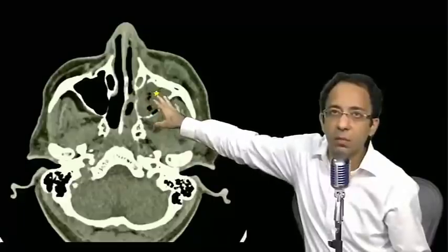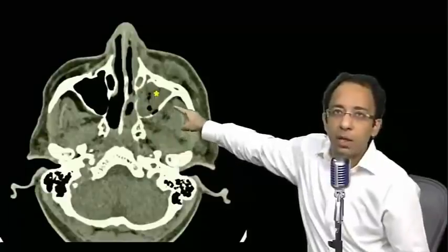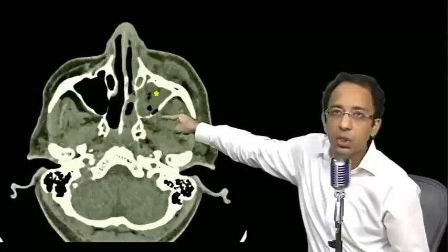I want you to look at this sinus on the left side. What do you see? It is opacified. Okay, but how do you know, looking at just one image, that this is not just sinusitis? Why mucor? One of the reasons here is, look at the dark area around the normal maxillary antrum. Can you see that is the normal fat plane? On the involved area, the perientral fat is infiltrated. You don't see that fat.